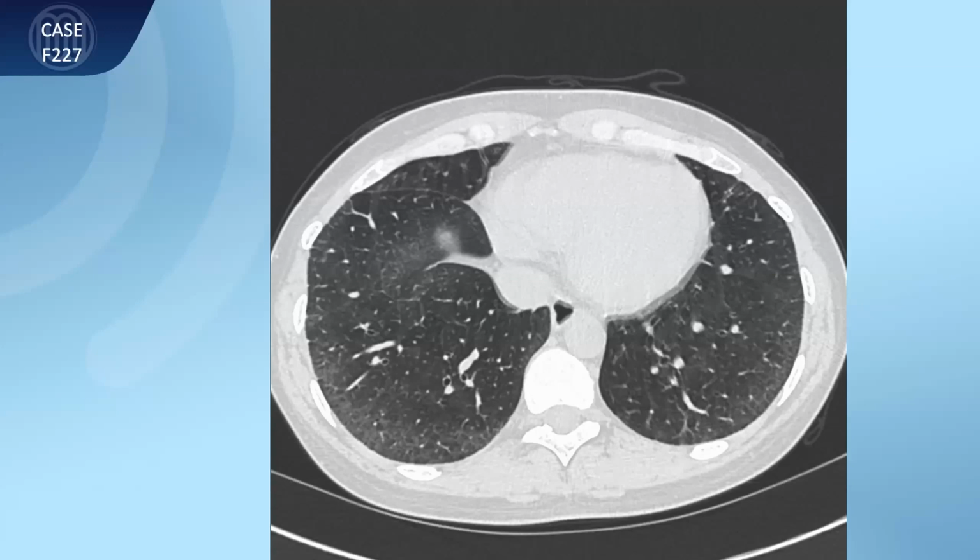Then there's a question, can vessels seen suggest vasculitis? No, also in patients with known vasculitis, the resolution of CT scan does not suffice to diagnose vasculitis. We do this in an indirect way by looking at the additional findings, in particular the distribution of ground glass, but this would go too far today. I won't talk about vasculitis.